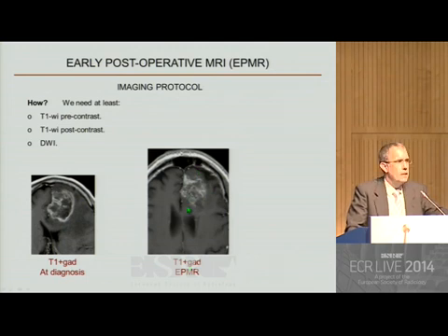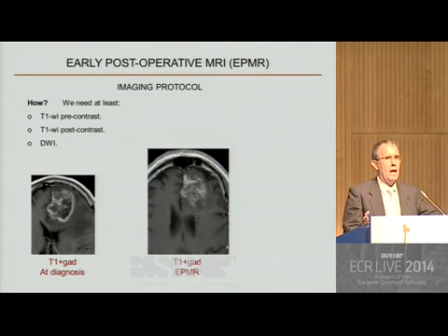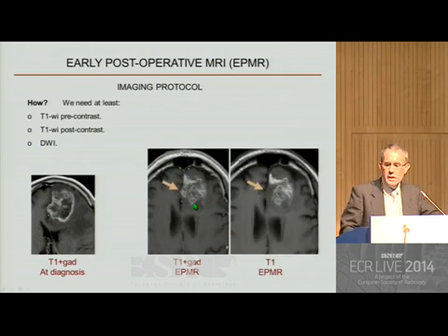You can see that all the tumor is here. But this could be somewhat offensive to the neurosurgeon. The neurosurgeon has approached the tumor to obtain a complete resection. And we are saying that all this is tumor. This is not correct. We need a T1 pre-contrast image to evaluate enhancements.